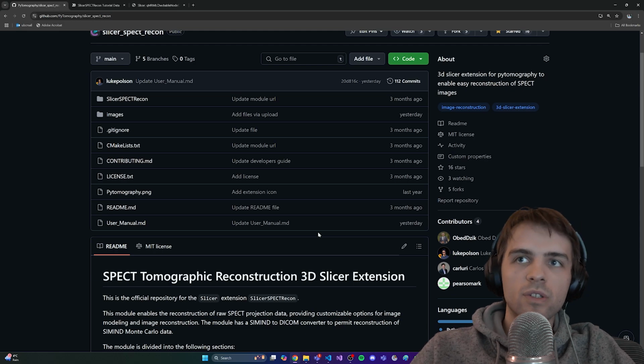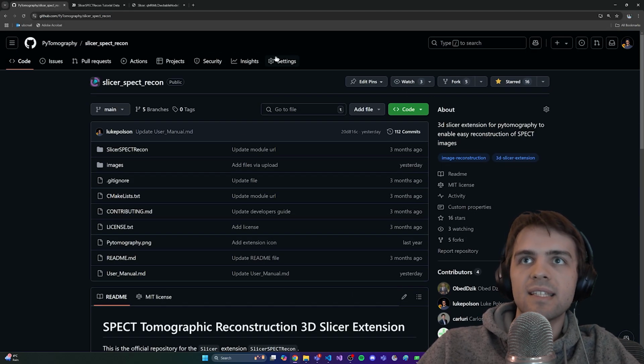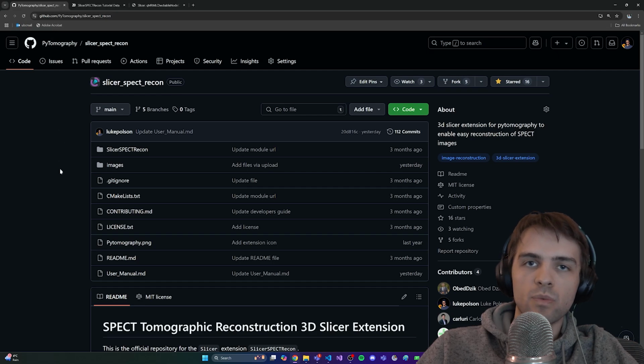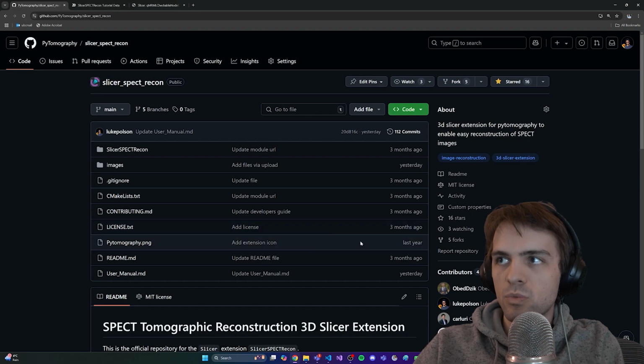This video is a tutorial demonstrating how to use the extension, and so there's a few things we'll need. This is the GitHub page for the extension. This is where we'll download it from at the moment. I'll put a link in the video to this page as well.